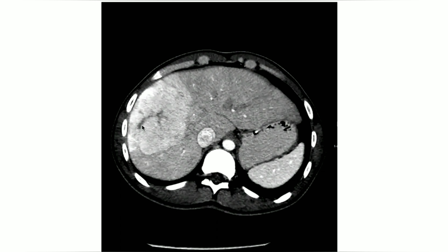Next, since you were thinking fibrolamellar HCC, one of the important positives or negatives in fibrolamellar is having central calcification, right? Because a hypervascular liver mass with central scar and calcification favors fibrolamellar HCC. And the pattern of enhancement, do you think it's homogeneous or heterogeneous hypervascular?